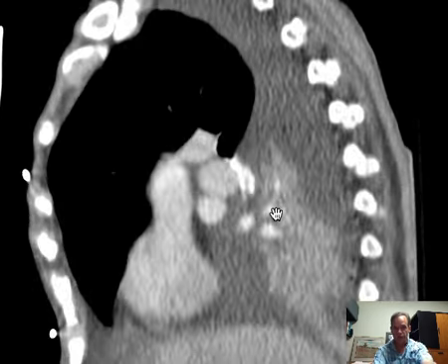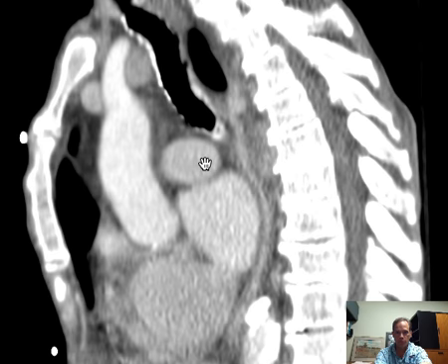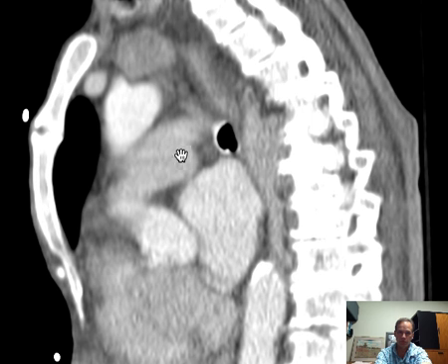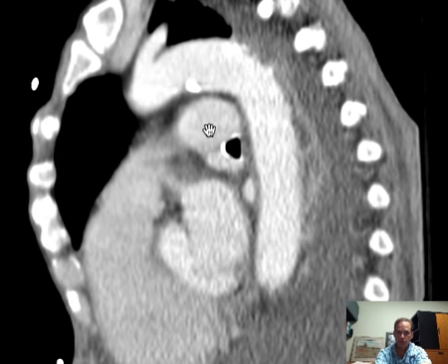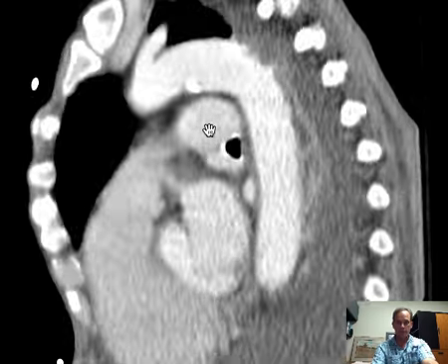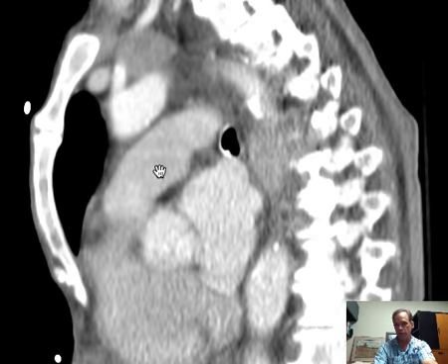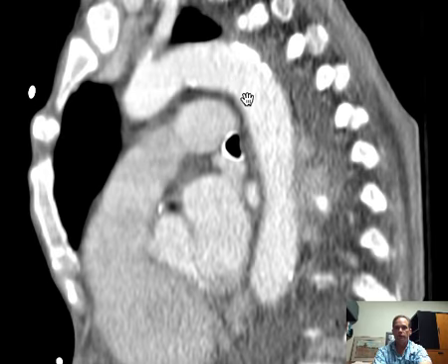We go back. We follow it back to the midline, and we see this is the right main pulmonary artery, and at a point we will find ourselves in the midline, which is where the distal main pulmonary artery is. And if we keep going to the left, then we will see the left main pulmonary artery, because this division, this Y-shaped branching of the main pulmonary artery occurs immediately inferior to the aortic arch.